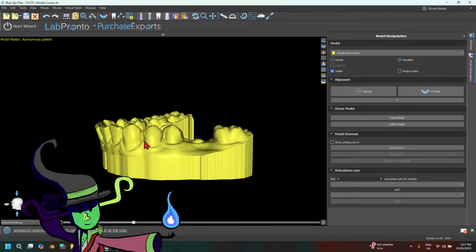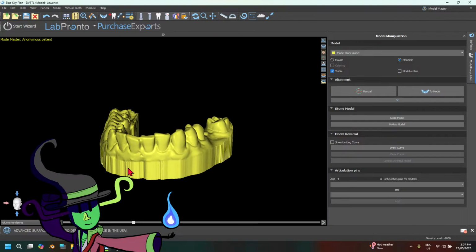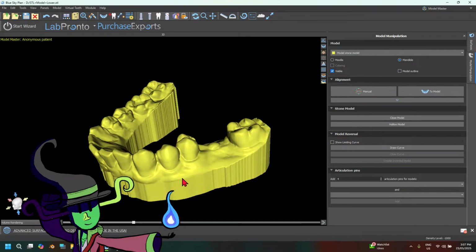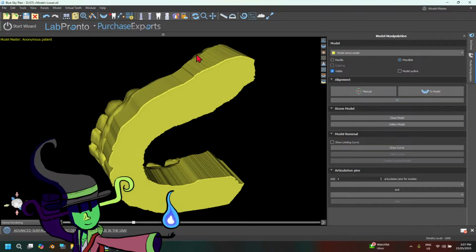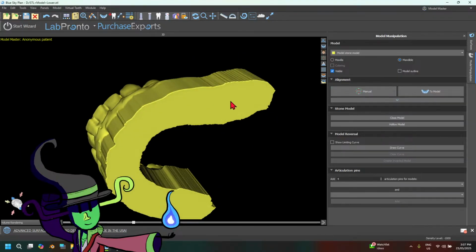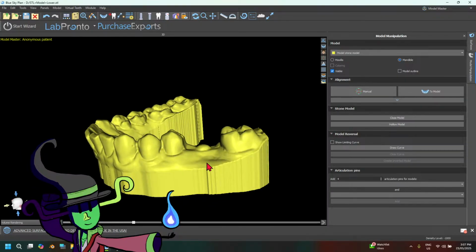And in our capitalist society, more resin just means more money to spend. So to combat the overconsumption of resin here, what we would do is hollow out, literally create a concavity within the model itself to save up on some much needed resin.